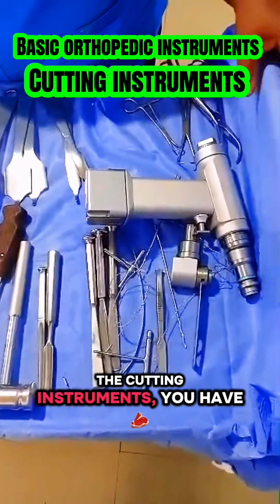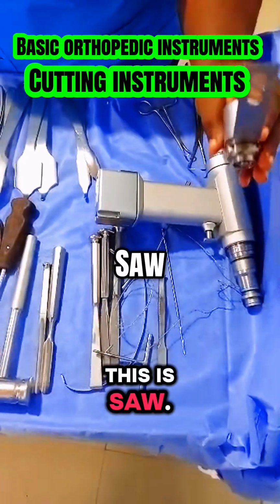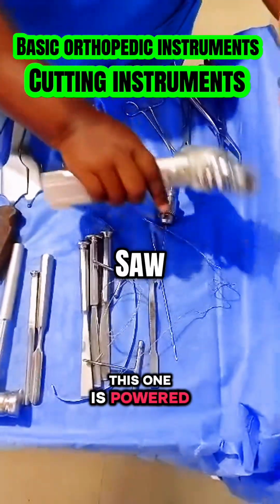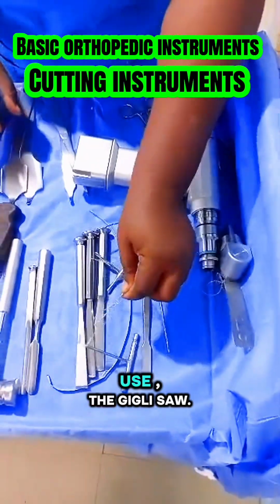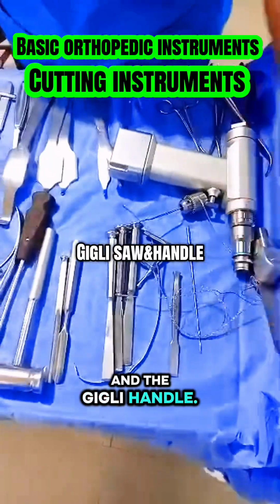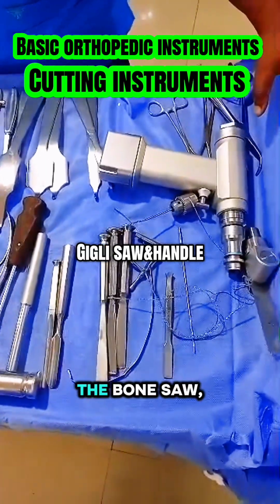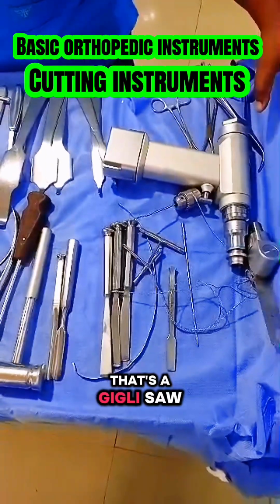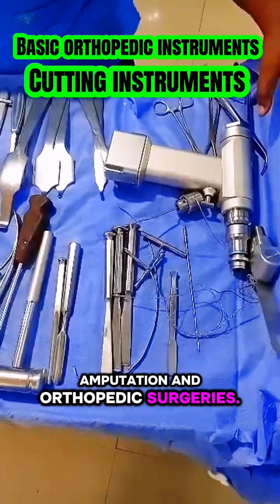The cutting instruments. You have the saw. This is a saw. This one is powered by the drill. Then you can also use the Gigli saw. This is the Gigli saw and the Gigli saw handle. So you use the bone saw, that's a Gigli saw, to cut bones during amputation and orthopedic surgeries.